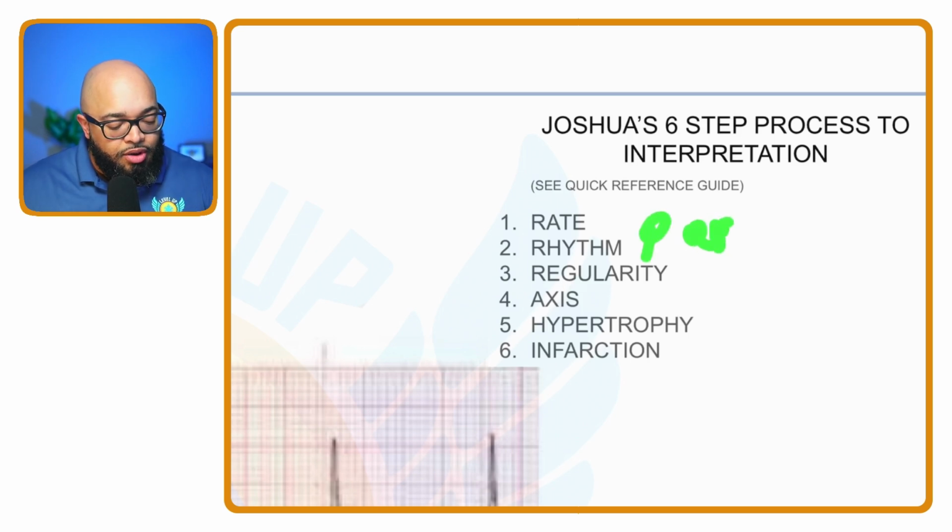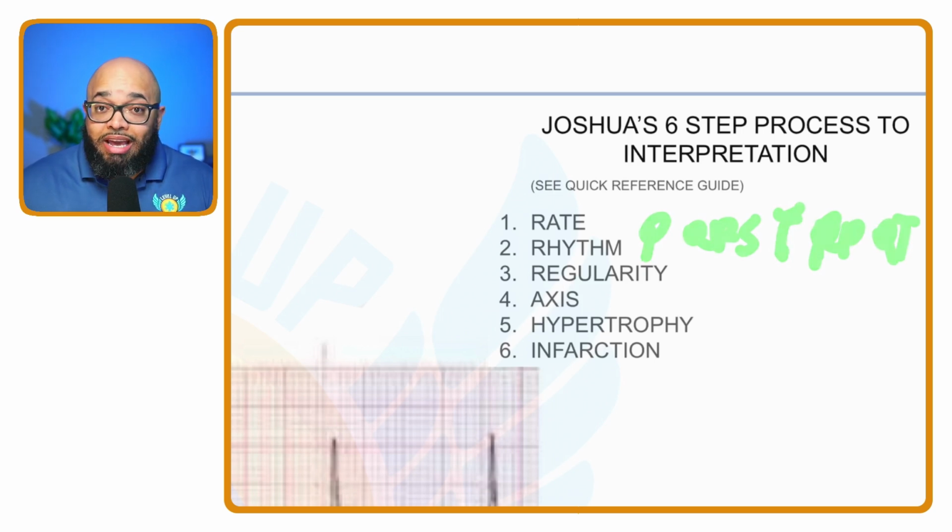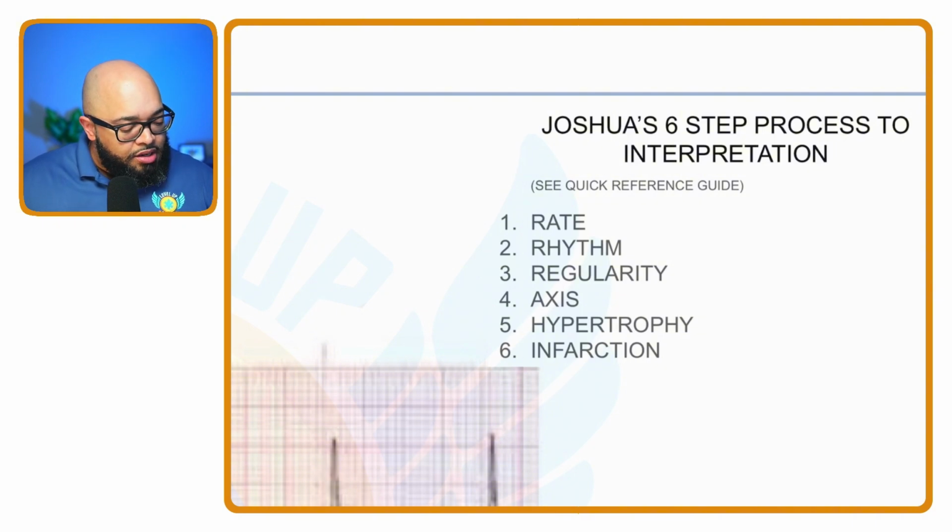To assess the rhythm, do you have a P wave? Do you have a QRS? Do you have a T wave? Okay. Is the PR interval like it's supposed to be? Is the QT interval the way it's supposed to be? Okay.